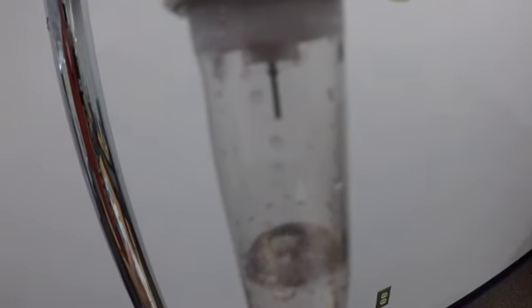1,000, 2, 1,000. I usually can't do this that quickly, but I got lucky. So we want to do 1 drop per second. And if I do 1 drop per second, that's going to be 60 drops in a minute. And if I have a 60 drop per milliliter set, that's going to be 1 milliliter a minute.